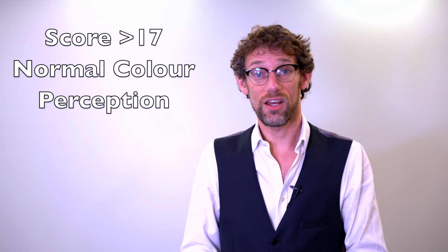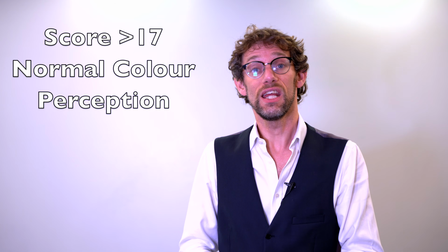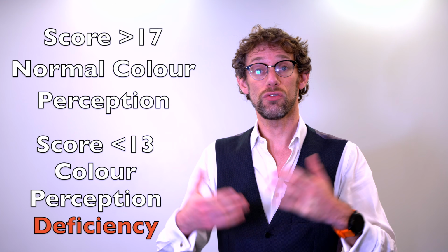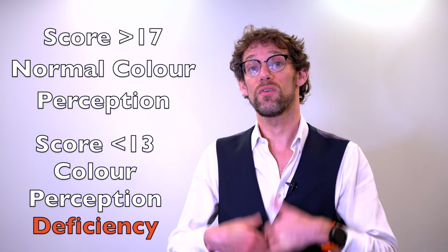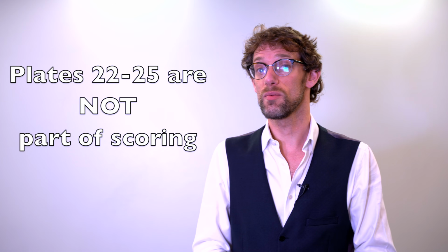Let's have a look what's actually happened. So, as we said, if you've scored 17 or over, you're fine. If you've scored under 13, you've got your colour deficiency. And we've asked you to look at plates 22 to 25 to determine what's going on with the colour deficiency.